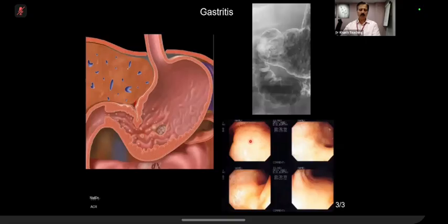What happens is that there is an ulcer, a depression. Around that is edema of the mucosa. So a similar thing projects here on a barium examination. In a dependent portion, the barium pools and the surrounding edematous mucosa gives you this low density. So this is aphthoid ulcer.